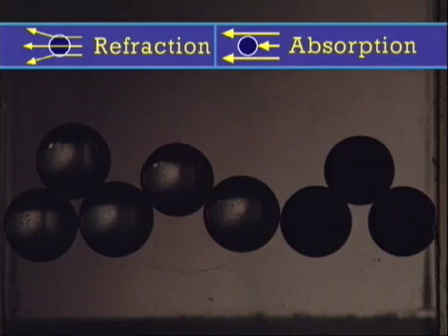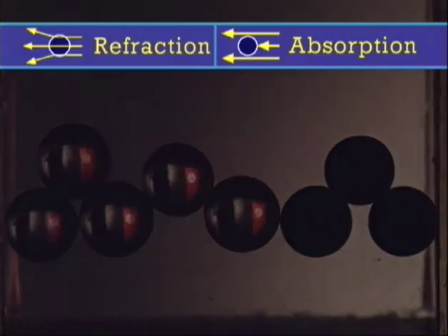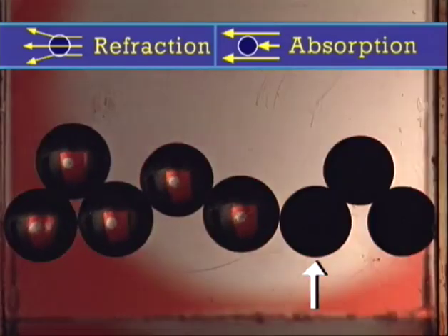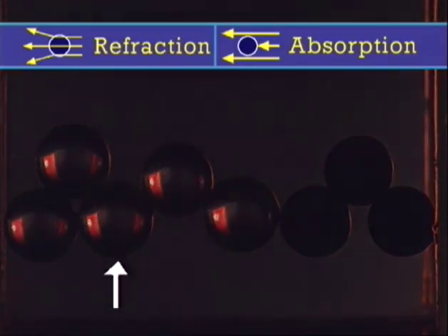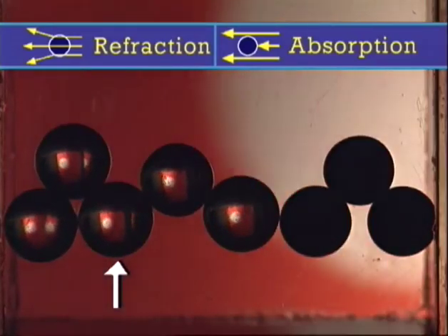Sometimes the phenomena of absorption and refraction look very similar, although their clinical significance may be different. How can we distinguish between them? The phenomena of absorption are rather invariable at different conditions of observation, while phenomena of refraction vary with the background.